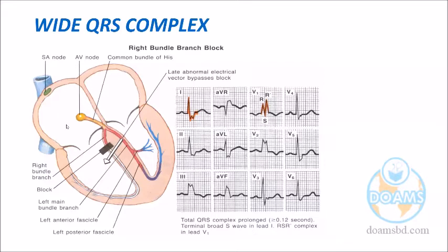A conduction problem means there is an increased width of the QRS. So if we look at V1, QRS has increased width, usually more than 3 small squares. And again, you see that it is not only wide, the appearance is like M. You see in V1 and V2, this is M. Usually, if the right-sided lead shows M, the opposite-sided lead will show W. I talked in other classes, it is called reciprocity. Those who attended the previous class can remember reciprocity.